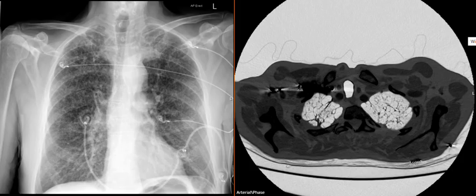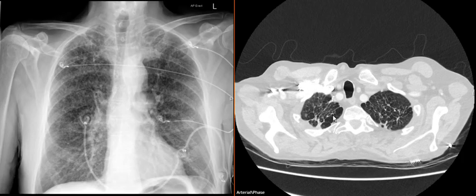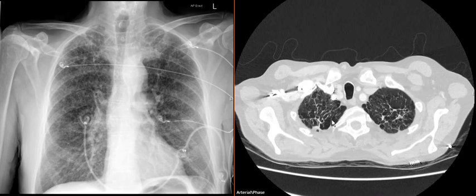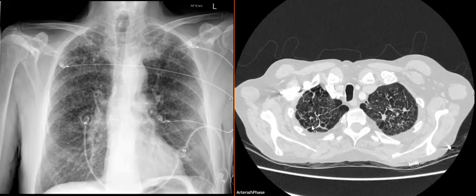And when you lose elastic recoil, your lungs don't exhale passively, so you need to exhale actively. And when you start exhaling actively, you're pushing on not just lung, but pushing on airways, and that's what makes that wheezy sound to some degree. So walls and voids, and then fibrotic structural changes. I don't know the exact smoking history, but probably extensive. So again, fibrotic changes coming down.